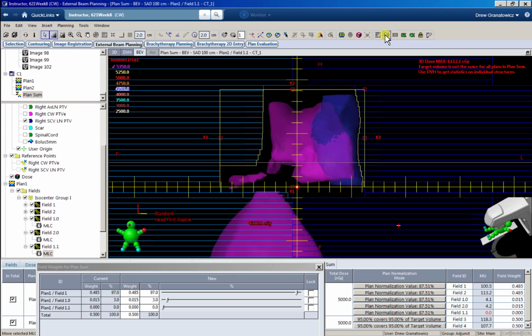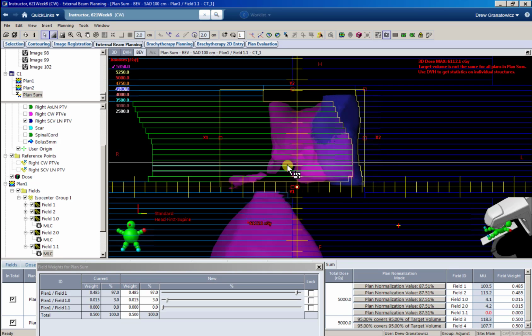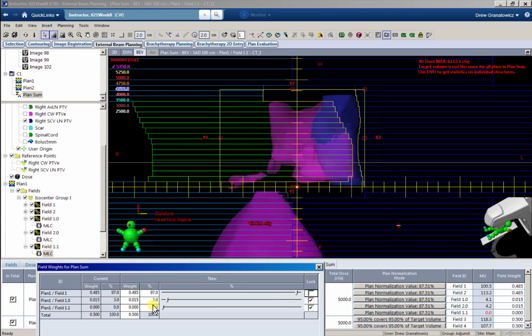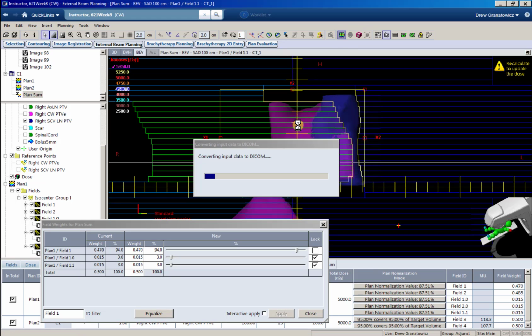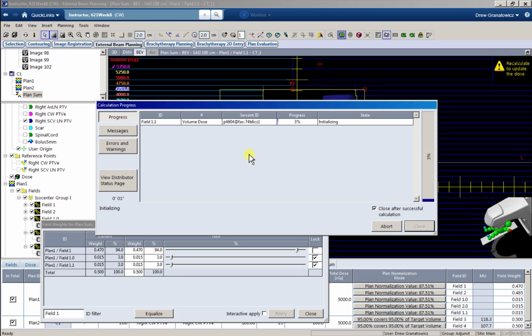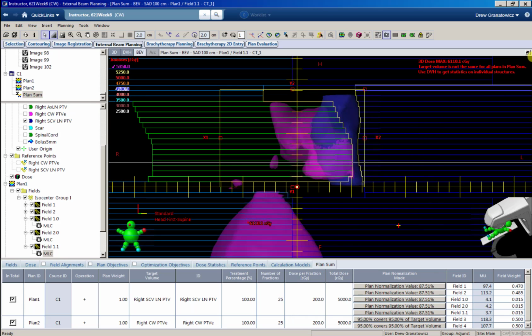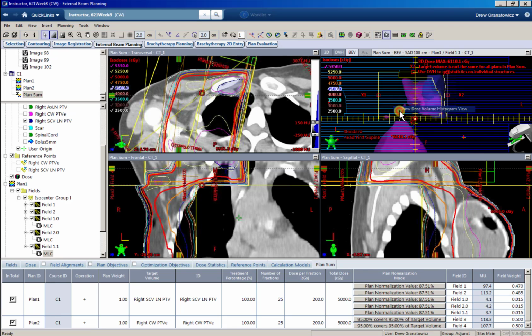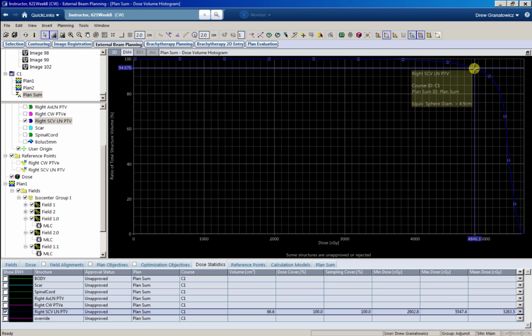It's usually what happens, and so if you try to get rid of all this dose from your lateral MLCs like this, you a lot of times just end up causing kind of some cold spots. Okay, so our 107 is going away. We were really close on coverage though, right? So it's a good idea to come check our coverage.